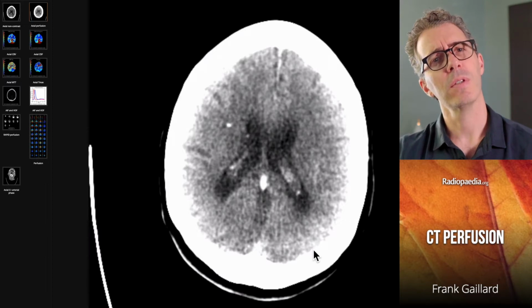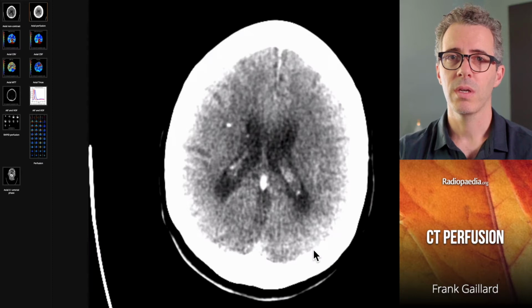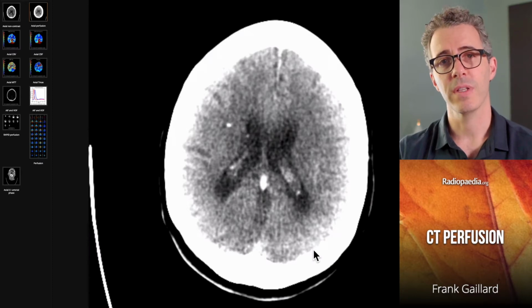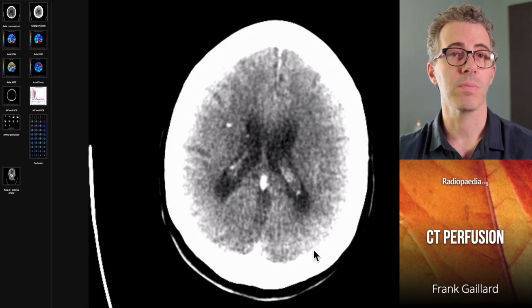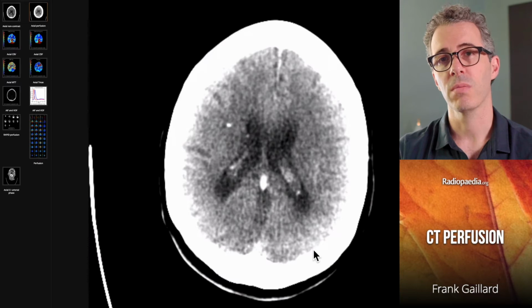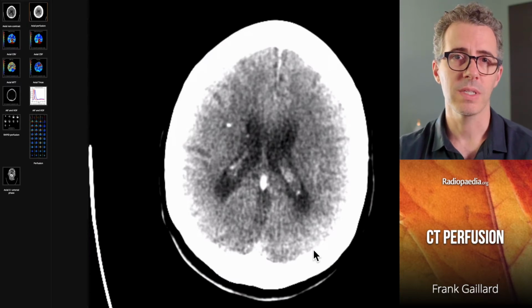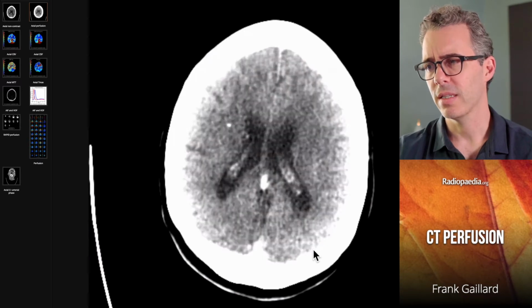And what happened was the patient was cannulated, had their perfusion imaging, and reported a lot of pain during that injection. So after the perfusion, the technician replaced the cannula with a new cannula, not recognizing that it was an arterial puncture, and went on to perform a normal CT angiogram. But how does that arterial cannulation lead to this?